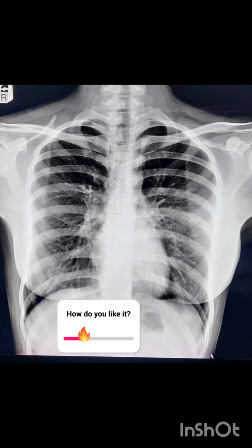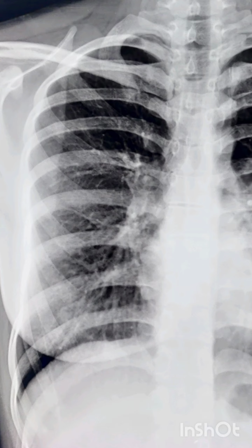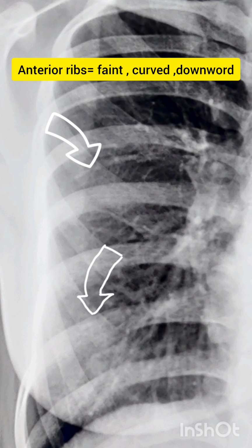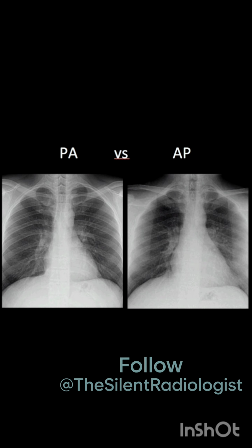Posterior ribs are the ones you see clearly and horizontally, because the X-ray beam hits them first. They're closer to the tube. The anterior ribs look fainter and more curved downward as they wrap toward the sternum. Now watch what changes in PA versus AP views.